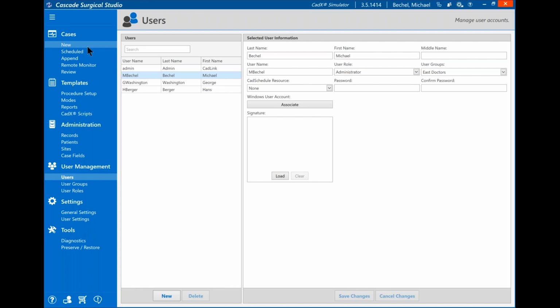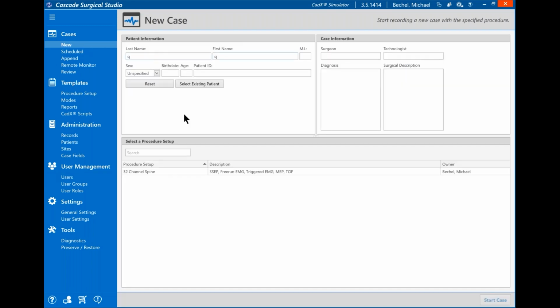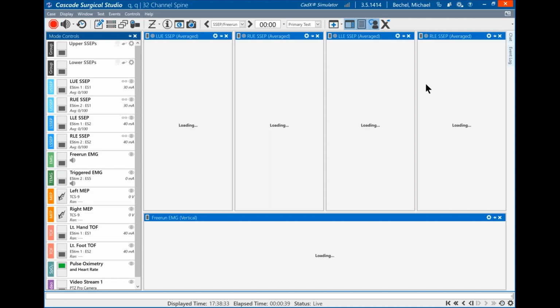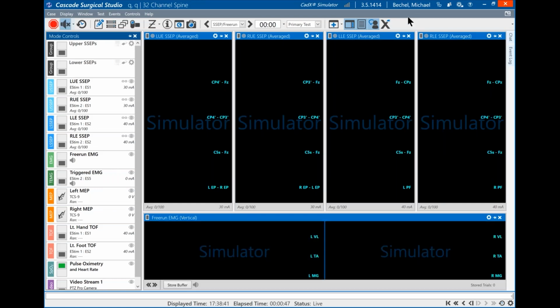So if I start a new patient and begin running, okay, we're launched.